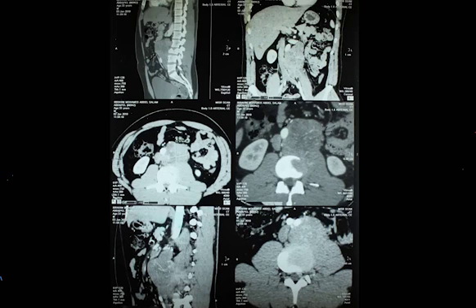And what is it doing to the aorta? Displacing it. In which direction? To the right, and anteriorly. Exactly. Okay. Do you think the vertebra is normal? The vertebra may not be normal. It seems to me that the lesion is infiltrating the vertebral body. Yes, it appears to be like that.